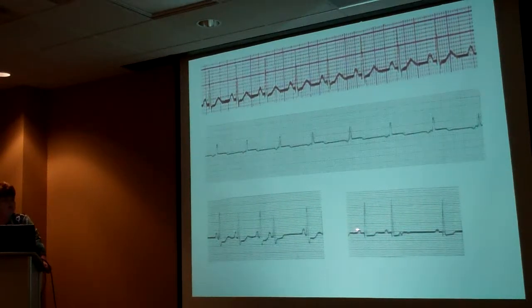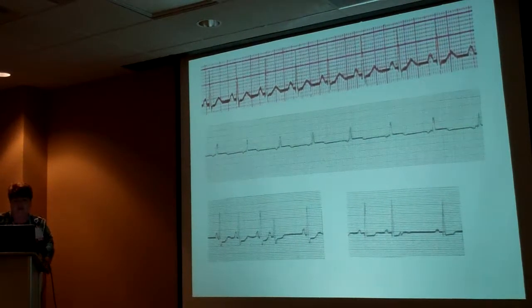Let's look at this one. Positive P, QRS, positive P, QRS. Then what happened right here? The rhythm's not regular. What's this? Here's the norm. What is this right here? If I laid this right on top of this line, it would go straight across, and that little blip right there would be a positive P wave. Well, what happened? It didn't cause a QRS. This would be a non-conducted PAC. Still a PAC, but it's non-conducted. So this would be a positive P wave. So you've got to look at your strip very, very closely.